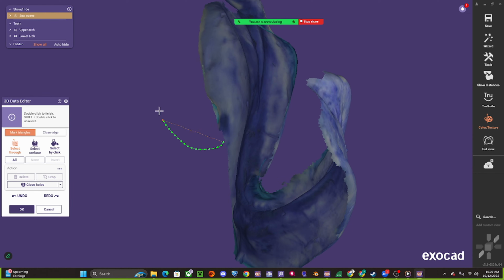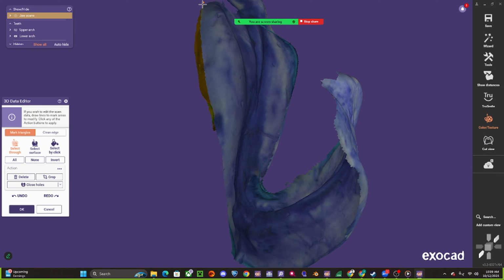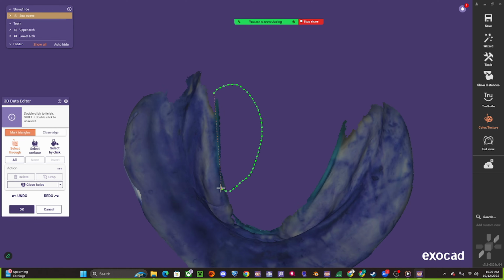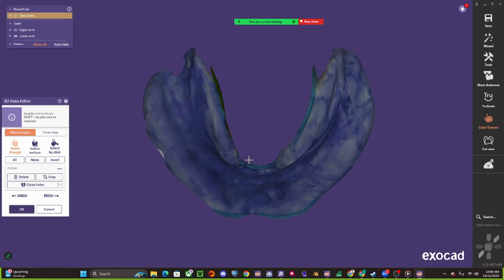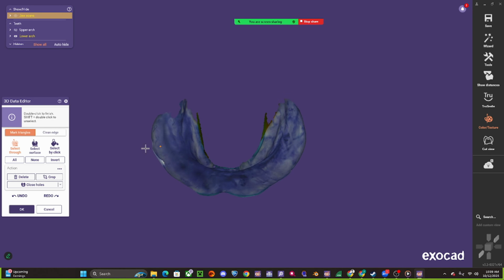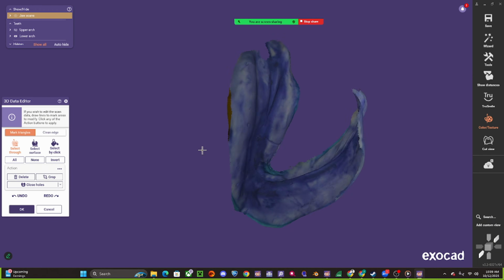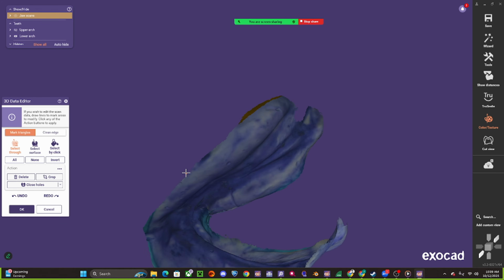We have a lot of overhang here, so it's really important to make sure you don't have overhang. When you have overhang, your fit gets messed with because it's messing with the extension area of how that data blocks out. When you have overhang, your data blocks out a little weird, because we do have to block out undercuts in some situations. And the software, when creating the base bottom, will think that the overhang is an undercut, right? So we don't want that. That's why we need to clean up any overhang like this, because it could essentially be looked at as an undercut.